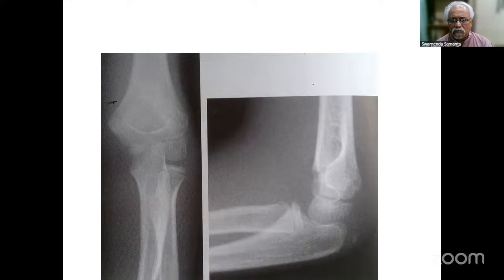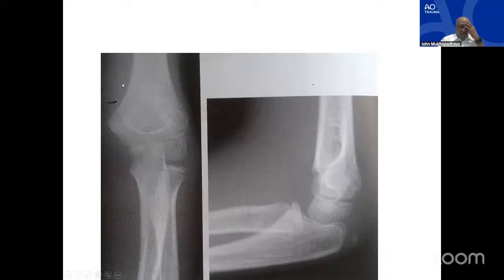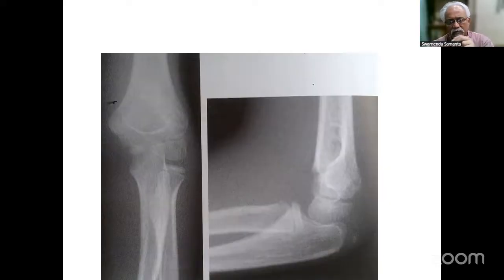You don't have to justify it with open epiphysis and all that, though you can see that the physis is open. And whenever you read the elbow epiphyseal things, remember the mnemonics for when they appear and when they fuse. Okay.